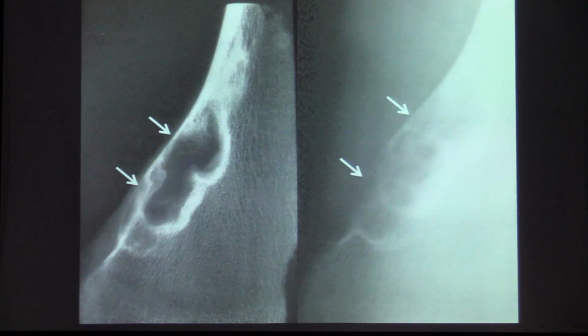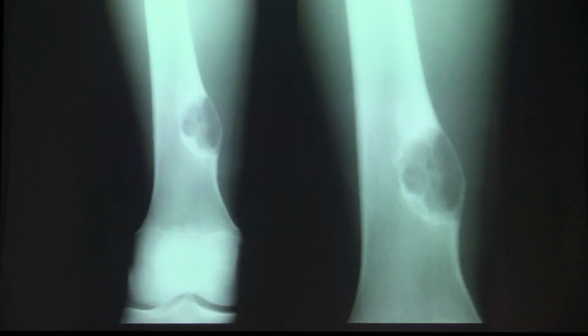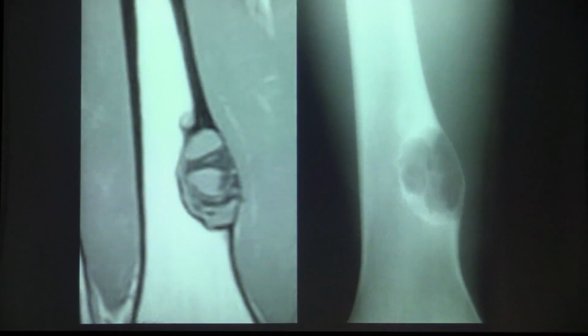We as radiologists don't really call that periosteal reaction, but in fact it is. And if we talk to our pathology colleagues, they would call that a shell-like periosteal reaction, but certainly some expansile remodeling. And here the nice macroscopic section showing that sclerotic margin blending imperceptibly with the adjacent trabeculae, with some xanthomatous areas at the more proximal portion of the lesion, and histiocytic changes more distally. Another example of a non-ossifying fibroma with that beautiful sclerotic margin seen nicely on MR and radiographs.